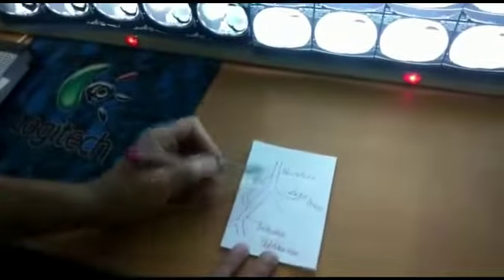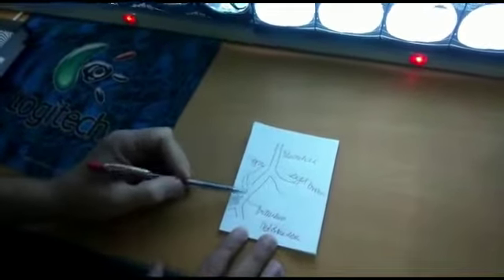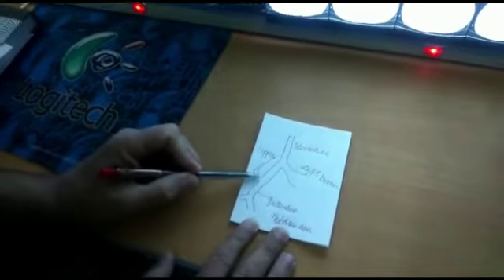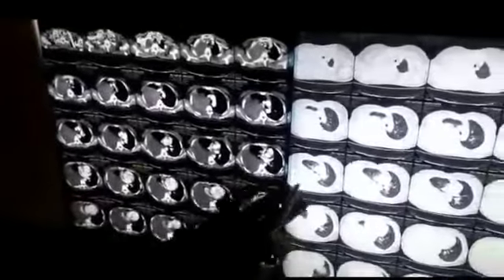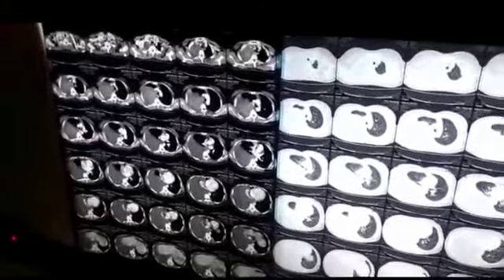If we focus on this diagram, this is the trachea, this is dividing into the left bronchus, this is the right bronchus. Before giving rise to the bronchus intermedius, it's giving the right upper lobe bronchus, which is appreciable in this scan as well. So this patient has a heterogeneously enhancing mass with massive pleural effusion, and the diagnosis is required.